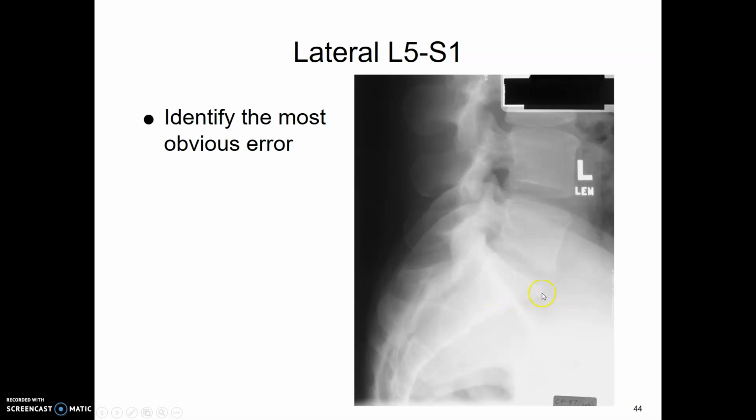Lateral L5S1, you can see the L5S1 space is not open at all. So ideally, we're going to throw an angle on this and repeat to open the space.